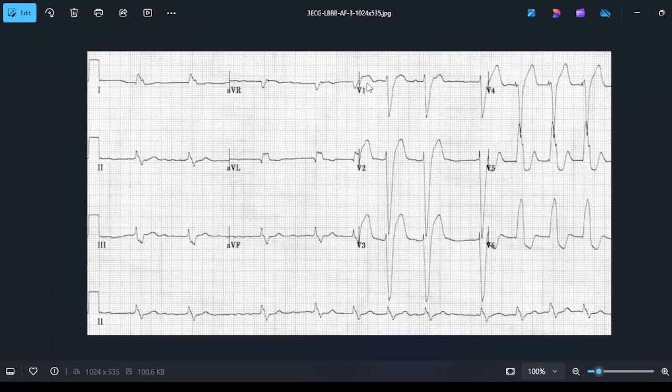See, you don't have an R wave in V1, V2, V3, right? Here there's a peaked T wave, so this is distracting. But check here, this one is the R wave, this one is the R wave, this one is the R wave. Did you find a big positive R wave in V1, V2, V3? No, right? So the typical W which we were supposed to see in left bundle branch block, we don't find it on the ECG. So how will we distinguish?